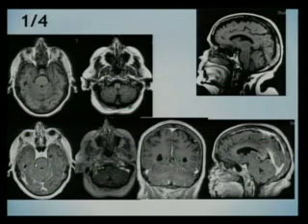And you see here, especially over the cerebellum, there are these linear streaks of bright white between the folia of the cerebellum. You can also see it here. And the orientation is different here because this is a coronal image. But this is what a leptomeningitis looks like with contrast, classically.